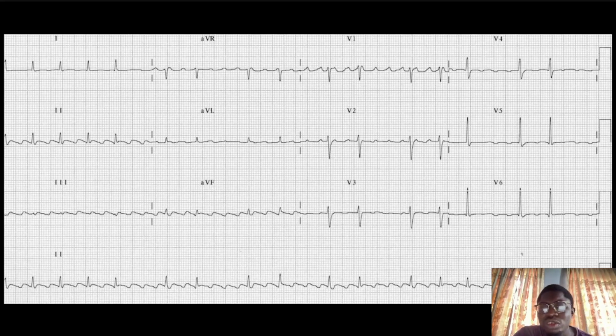You know how to check for the bundle branch block. We use William for left bundle branch block, and we use Marrow for right. I will make a video around that soon, but none to be identified in this particular ECG.